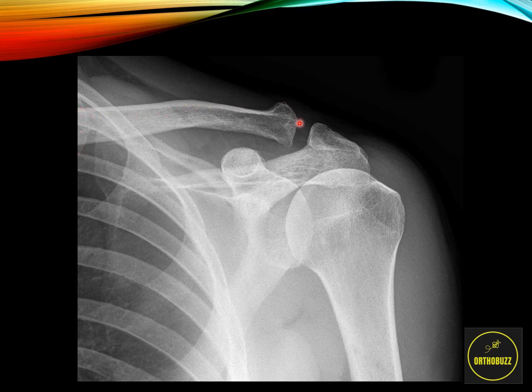This bone over here is the clavicle, or the collarbone, and this is the lateral end of it, where it articulates with the acromion, which is a part of the shoulder blade or scapula. Another part of the scapula is the coracoid, circled over here, and this projects anteriorly from the shoulder. The lateral end of the scapula ends in the glenoid fossa, and this is the articulating surface with the spherical head of the humerus. So those are the key parts of the shoulder X-ray.